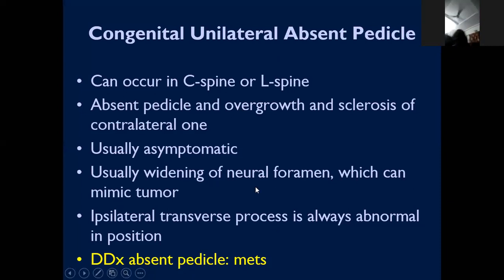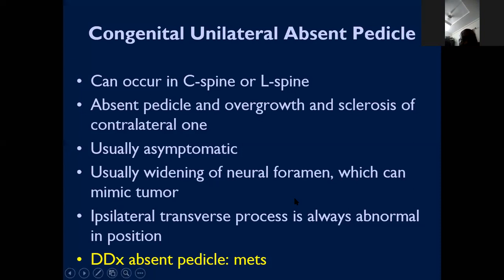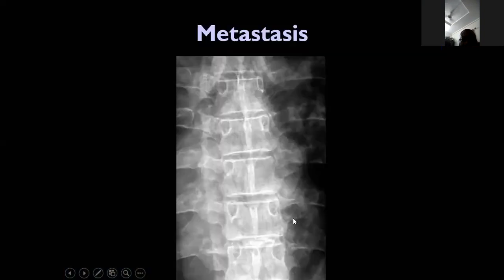Perfect. When you find this in a young patient, you think about a congenital cause. Perfect. So when it is metastasis, it looks like this. Can you tell me which one? Let's make a tracing. This one is fine. This one probably fine. Here fine. Here, I think it is here, right? Do you agree with me that it should be here? Yes, here, left. Okay.